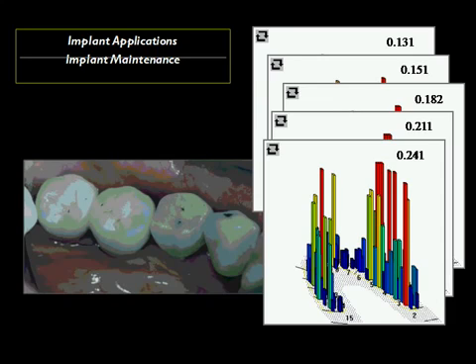I believe that we should have contact on the implants, otherwise they're non-functional and high-priced space maintainers. So I want contact. I just want delayed contact on the implants, allowing for depression of these natural teeth into their socket. So as I play forward, notice that the primary force is anterior to the implants now. It is opposing the first bicuspid and opposing the central incisor. We do have some contact on the anterior abutment, but the higher, earliest force is anterior to the implants.